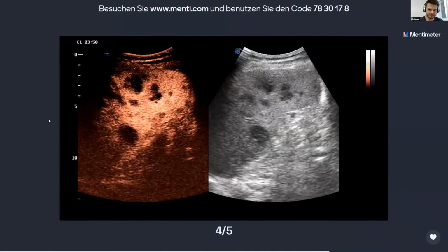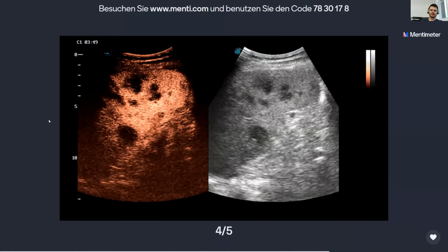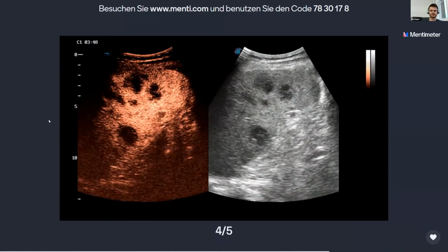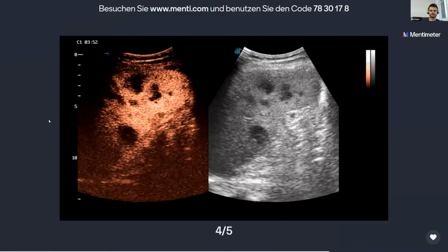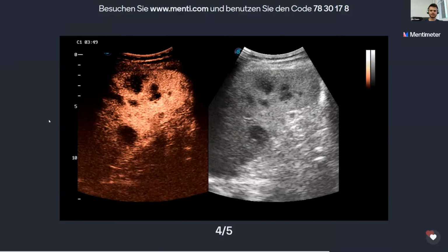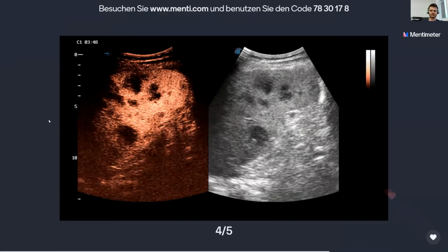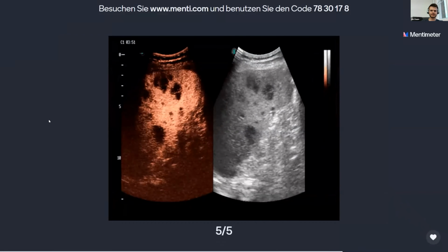The fourth one. You can also see it's a little bit different to our last case. And also the last loop here.